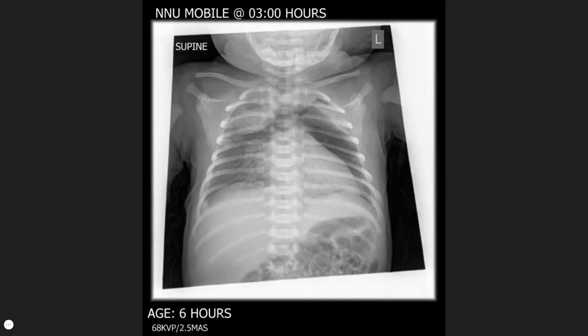In this example, both lobes of the thymus are lifted off the mediastinum by air within the mediastinum itself. This is called pneumomediastinum and is not infrequently seen in neonates. It is idiopathic and often requires supportive management only.